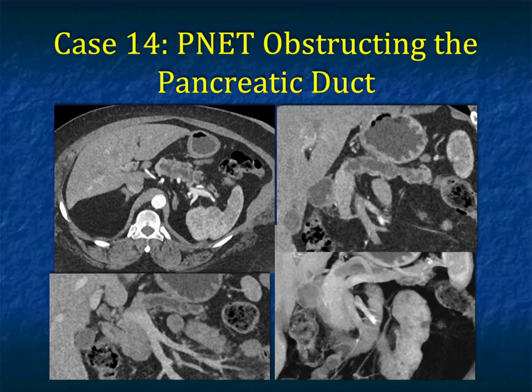It's subtle, the mass that's present, but I would say it's an adenocarcinoma until proven otherwise. If you look hard with a vivid imagination and knowing the correct answer, you can say, well, this lesion is a bit brighter, but it's really not hypervascular. It's maybe a bit denser, but I still would go with an adenocarcinoma. Nevertheless, this lesion will need to be removed or EUS with biopsy.